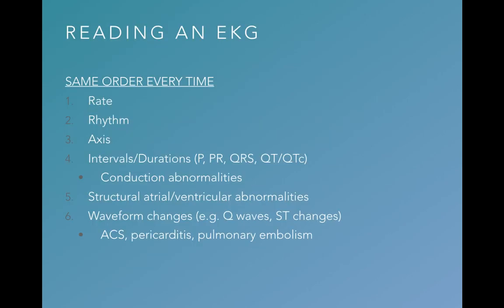Okay, so let's get to how you actually read an EKG. The most important thing, like most in medicine, is to have an order that you like to use. So this is how I do it. You do not have to do it this way, but I will say that the first two steps everyone does the same, which is the rate first and then the rhythm.